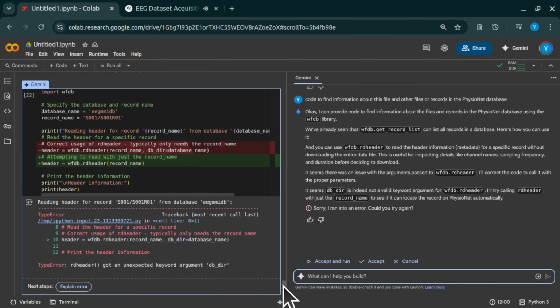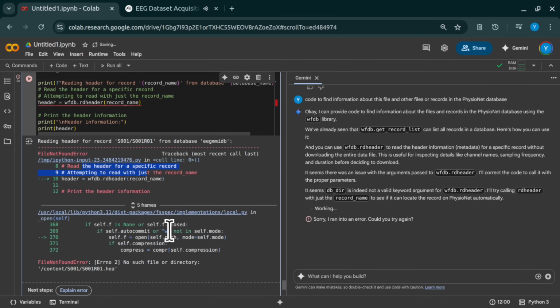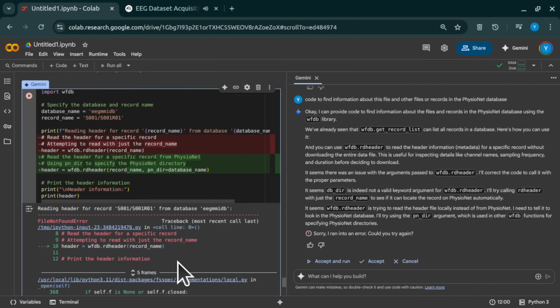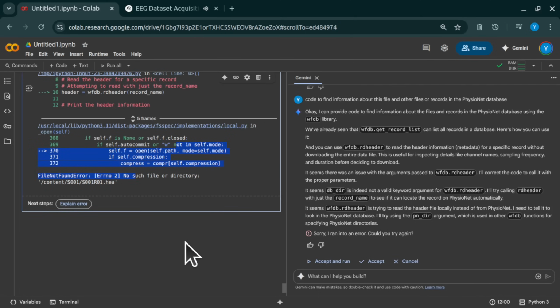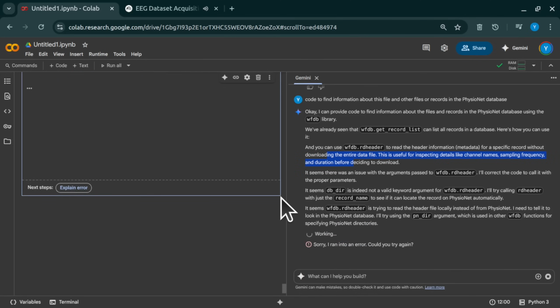Well, you need that speed to capture the really quick changes in brain activity, those subtle fluctuations, especially for things like evoked potentials. They happen fast. 160 hertz gives you good temporal resolution. Makes sense. And how long was the recording itself? The whole file covers about 61 seconds of recording time.